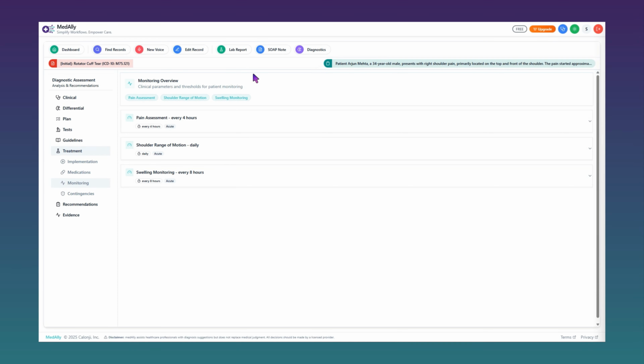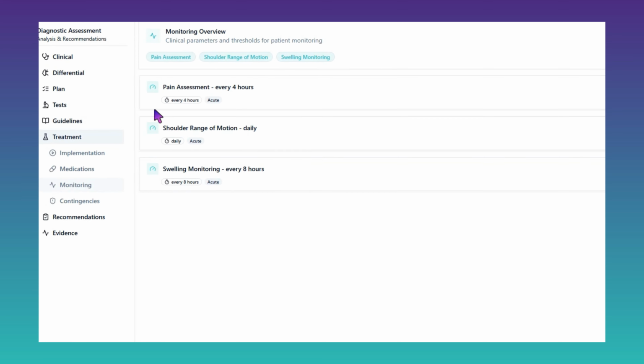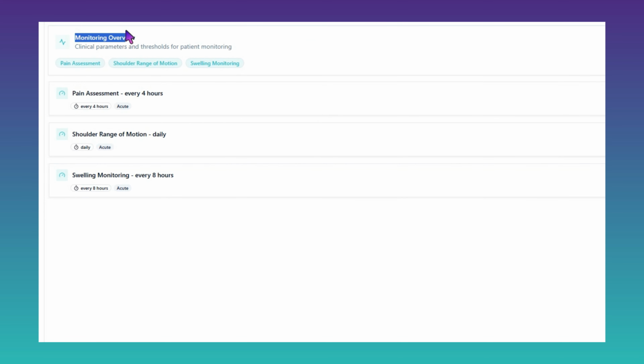Hi there. In this video, we will take you step by step through the MedAlly Diagnostix module. Let us move into the Monitoring tab under Diagnostic Assessment. This section helps you understand the clinical parameters and thresholds that guide patient monitoring.